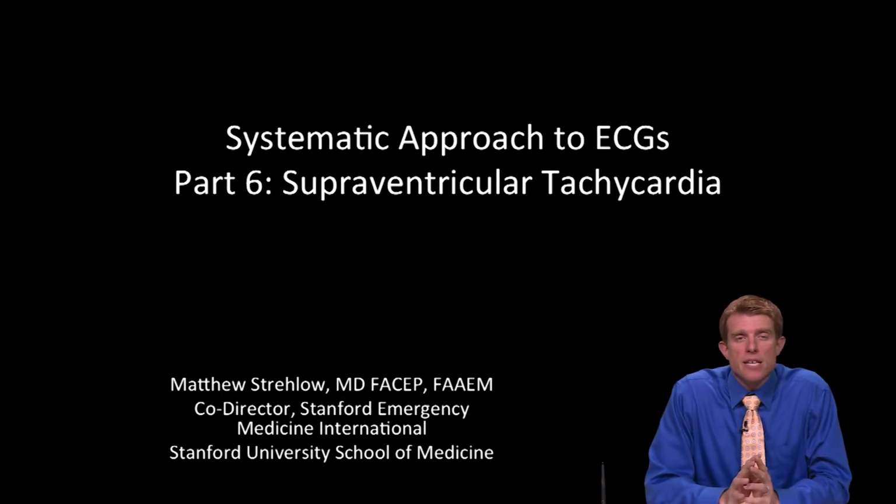Hello, this is part 6 of our systematic approach to ECGs. And in this part, we're going to talk about supraventricular tachycardias.